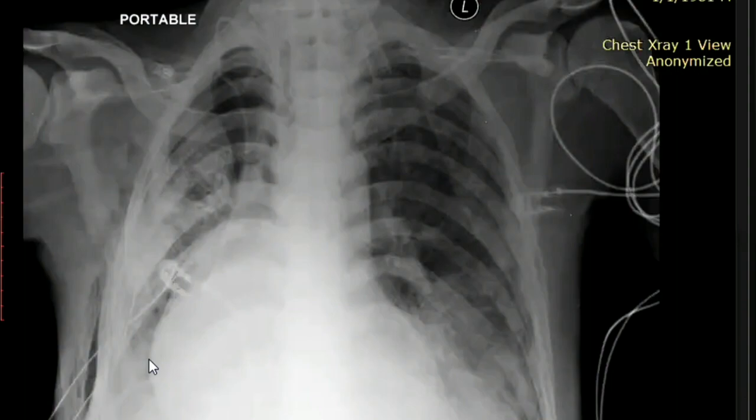However, I would like to confirm my findings with a more advanced modality, probably a contrast enhanced CT scan, and for the multiplicity of the lesions, I would also like to go for contrast enhanced CT scan of the chest and abdomen for further evaluation, and a bone scan for the osseous lesions.